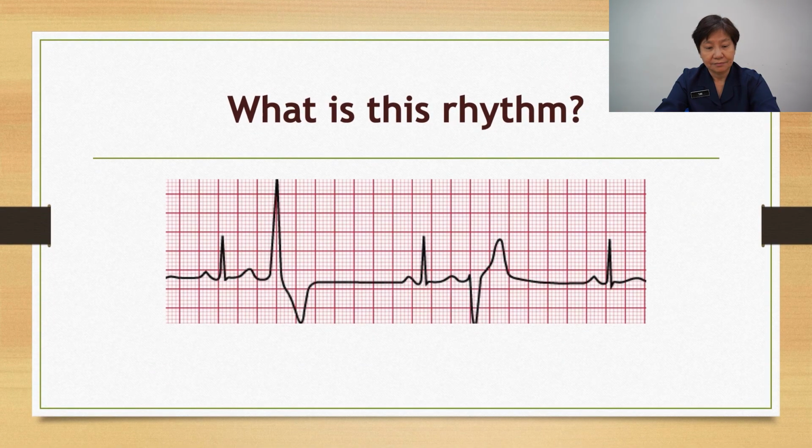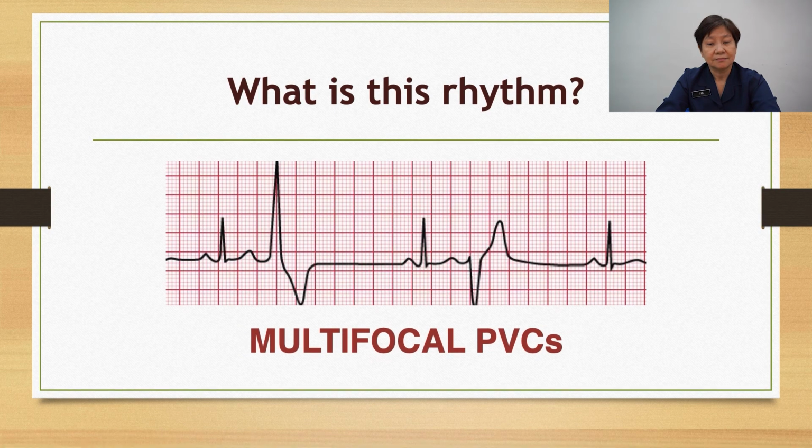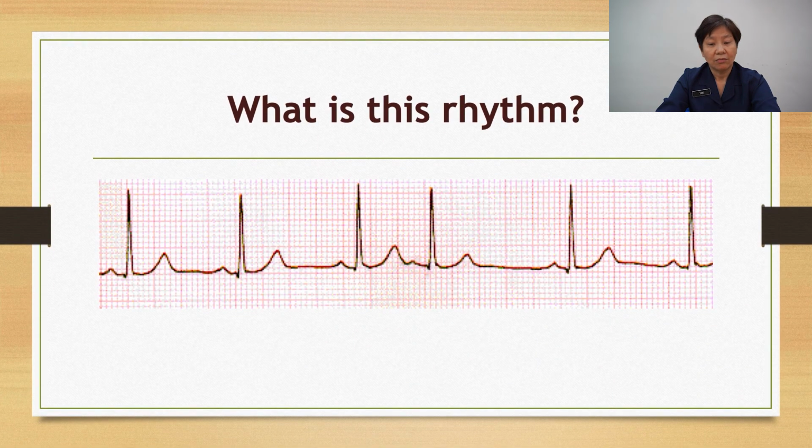Next, this is what I just told you already. A different configuration of the PVC is multifocal PVC. Okay, can you see any irregularity over here? The first, second, and third are sinus beats. Okay, come to the fourth one.